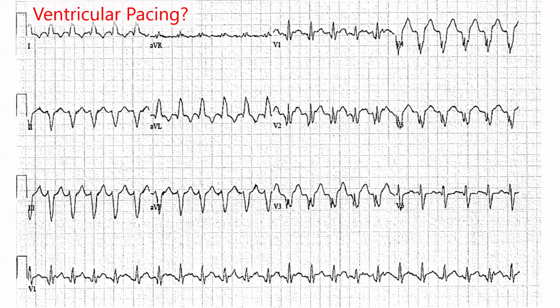So what are some other possible explanations for this? Is this ventricular pacing? I haven't said anything about a pacemaker in this patient, and they didn't tell us much about anything there. And it's always possible that a pacemaker is in place, especially these days if you have no chest X-ray yet. And I didn't mention anything about an X-ray for this patient yet. And it's not necessarily the case that the person will come in with a conventional system. It could be that this person has a leadless system, right? That won't leave any superficial marks.